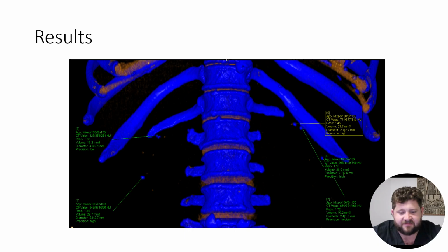One of these will be the picture you see on the screen here. Now, this is interesting because it actually shows us the Hounsfield units at a mixed kV, the 100 kV, and the tin 150 kV. So this here is showing us the exact attenuation profile and how it's used that photoelectric effect to determine what material this particular voxel is made out of. Once we've checked through and we're happy with the results, we hit Save and Send to send them to PACS.